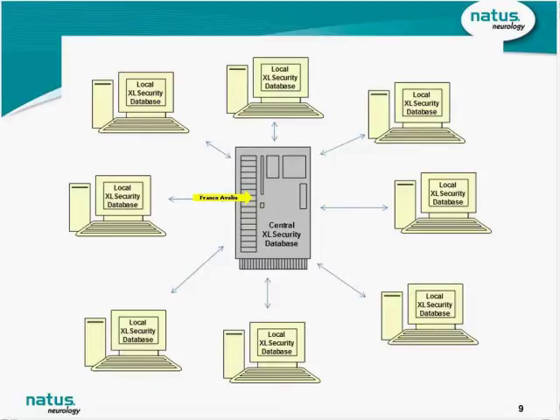In this type of scenario, if you are interacting with the server, this is likely your setup unless you or someone else changed it. In this setup, your rules relating to security are stored on the server. Each computer also contains a database storing these security rules.